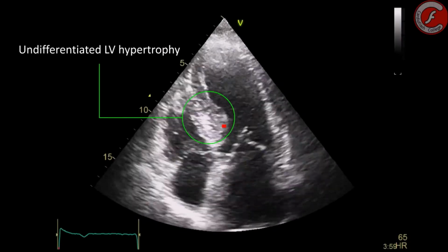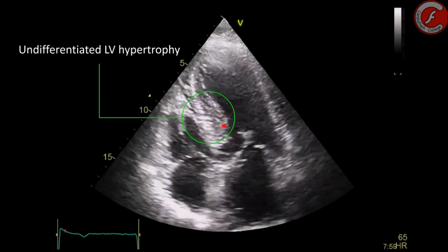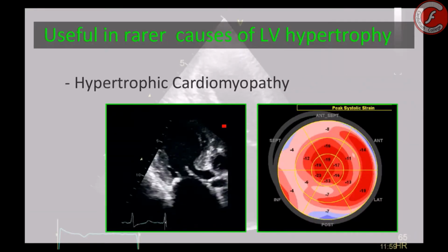But what about left ventricular systolic function? Well, very simple. Although the ejection fraction is usually preserved, the global longitudinal strain is usually decreased at the expense of the most hypertrophied areas with extensive fibrosis, which can become a prognostic factor for heart failure or sudden death.